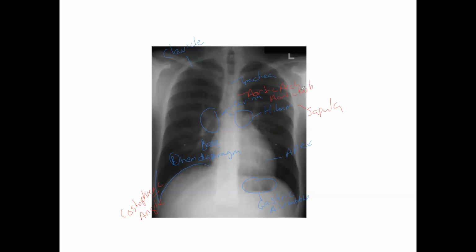So again, terms radiolucent, radiopaque. Radiopaque shows up various shades of gray or white, and radiolucent shows up dark. And so this is a general overview of some basic chest x-ray stuff that we can look at as respiratory therapists, or to get you started if you're in respiratory therapy school, on being able to start making sense of what it is that you're looking at.